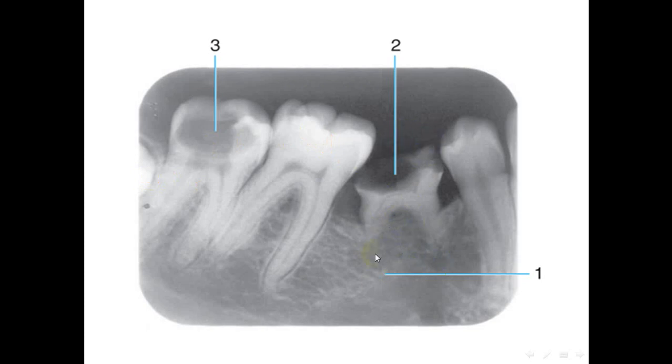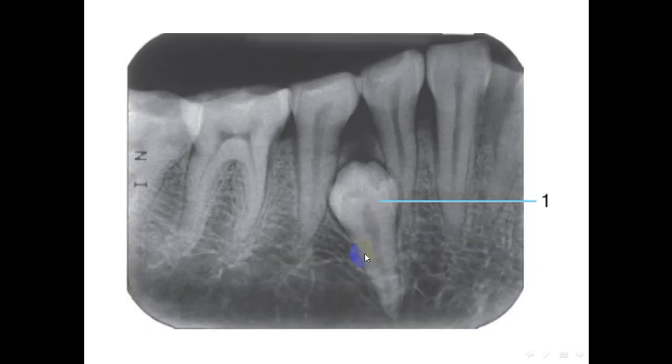If you cannot see the lower 5, and this small molar tooth represents what we call an E, which is the second deciduous molar, and there is no permanent molar, this is called congenitally missing teeth.